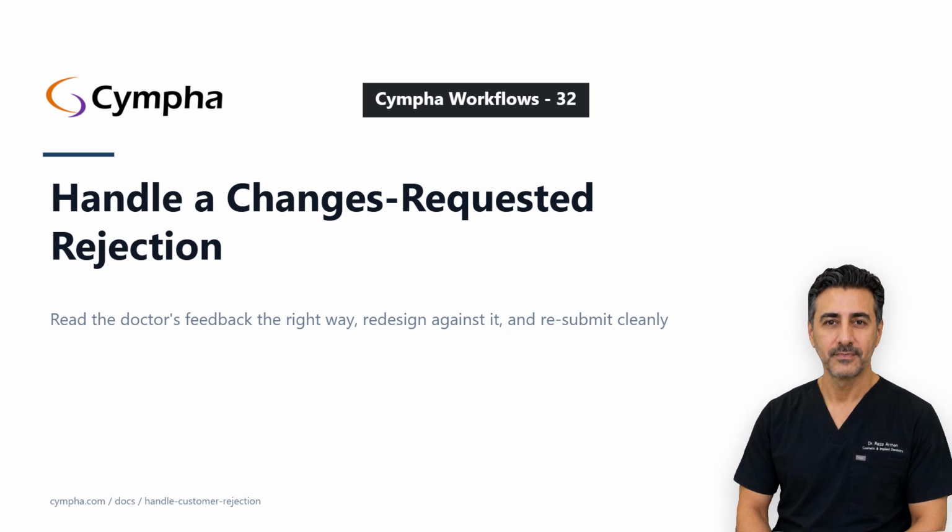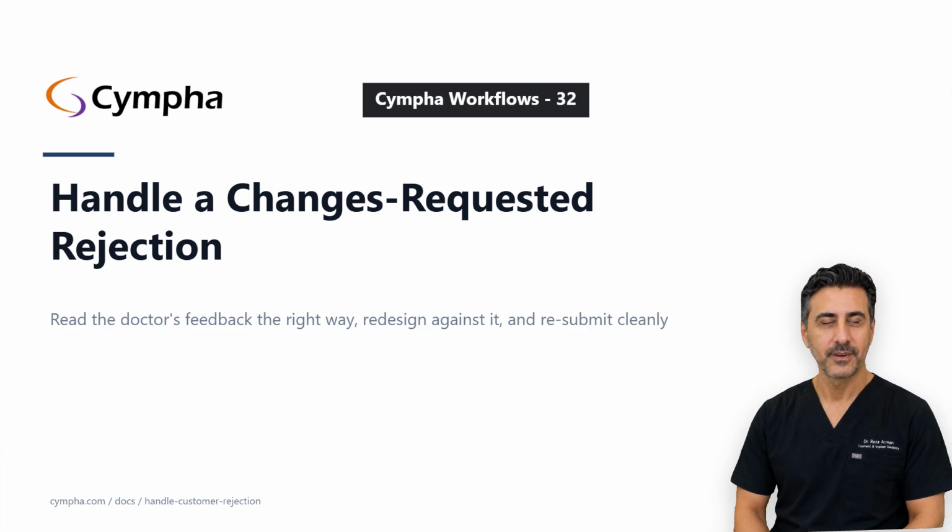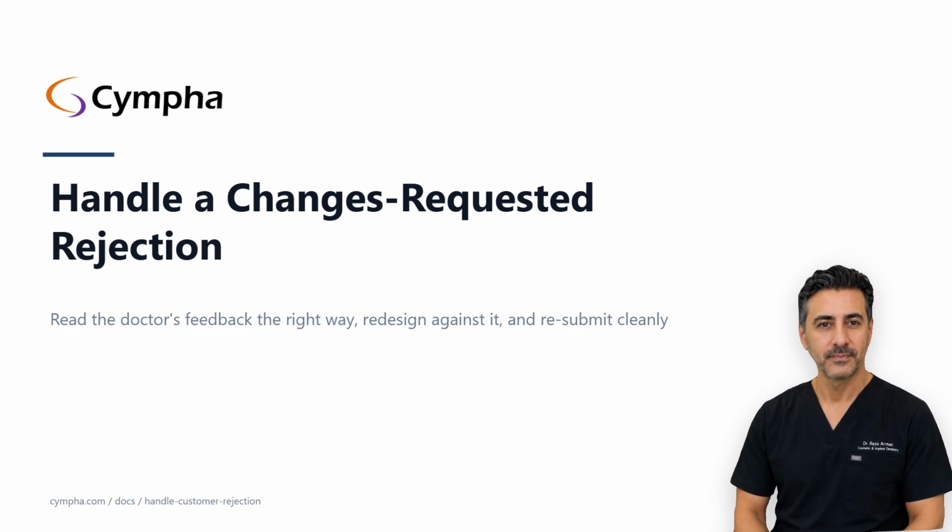Welcome to Guide Mia. Today we're going to talk about handling a changes requested rejection. Your case went out for approval, the doctor clicked request changes, and now it's back in your court wearing a rose-colored badge. This happens to every designer, and Cympha has a specific, tight loop for it.